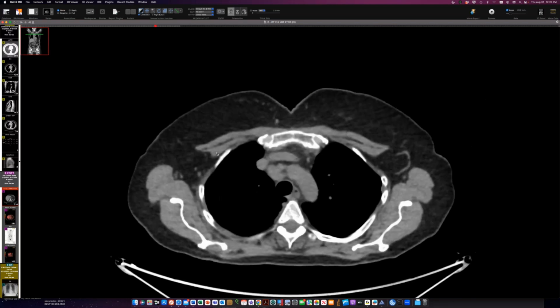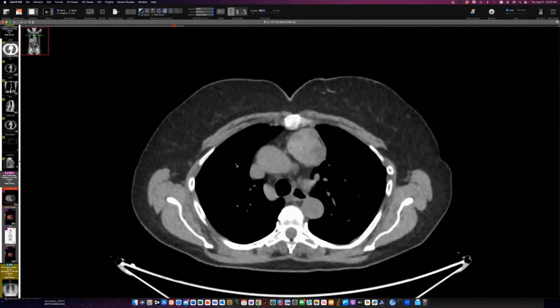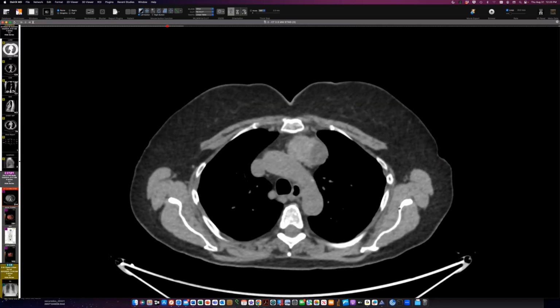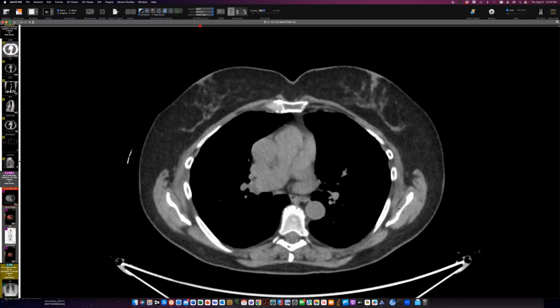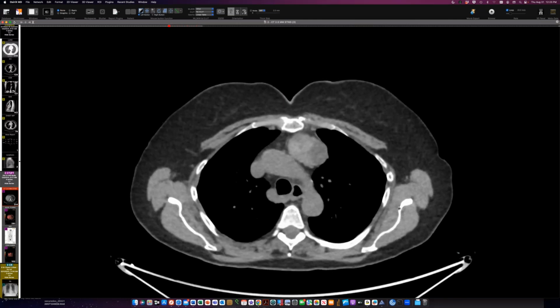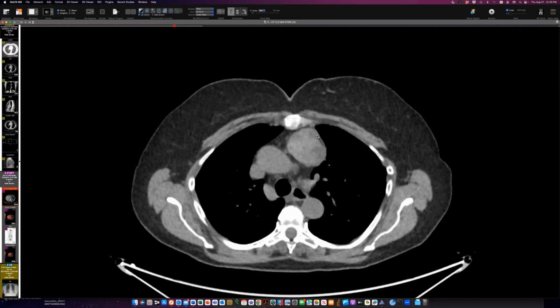And indeed, there is a mass in the upper mediastinum. It has a little bit of calcium in it, has some lowish attenuation in it, and at the top seems to disappear, so it's fairly discrete. It's fairly firm looking. It looks firmer than a thymoma. It's bulging against the mediastinal contour here. So I don't know. What do you think?